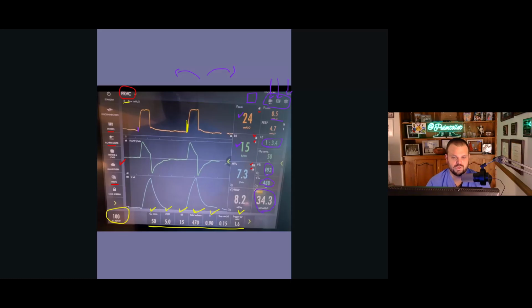So this was a quick tour through just a regular vent screen, which I think is important because some might not go over it as in depth, but it is important, and we're expected to report these data points out. And if there's something wrong or amiss with the ventilator, it's sort of where you should start. So these were the things that we were setting and measuring.